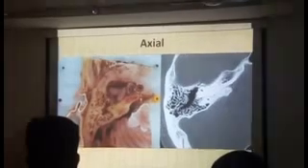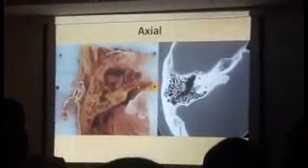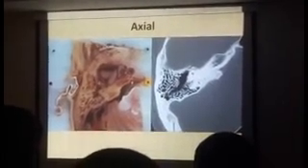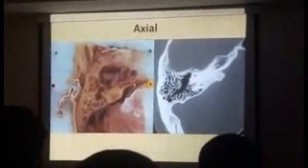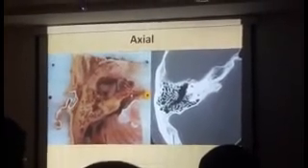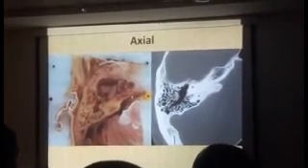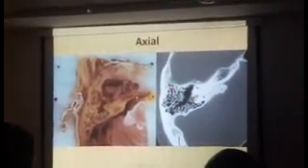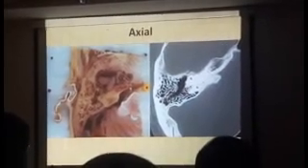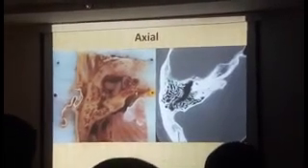So this is one of the uppermost scans wherein you don't see any ossicles. What you definitely see are the two limbs of the superior semicircular canal, with faintly the subarcuate artery, or what is in radiological terms called the petromastoid canal, visible in between the two limbs. This is probably the antrum of the upper part of the attic area with the antral air cells all around, and you can see the correlation on the anatomical picture.